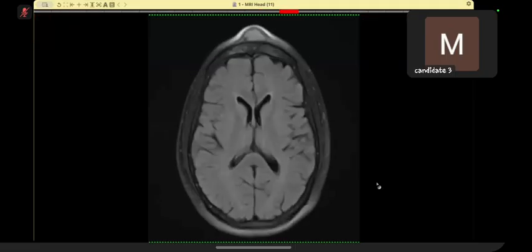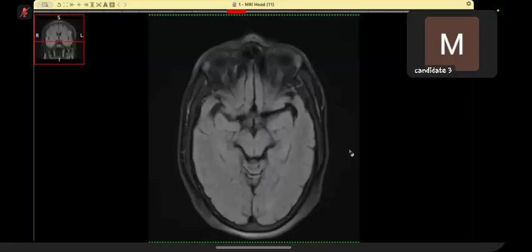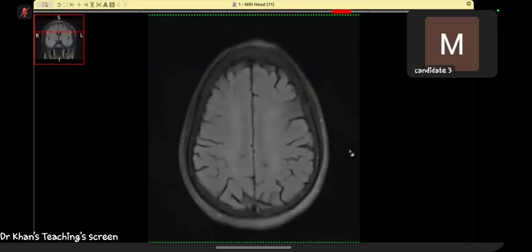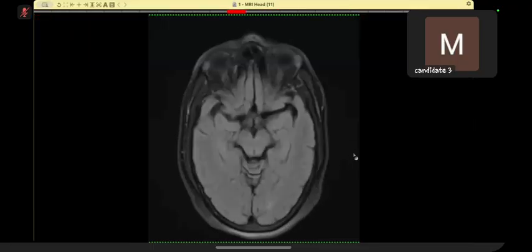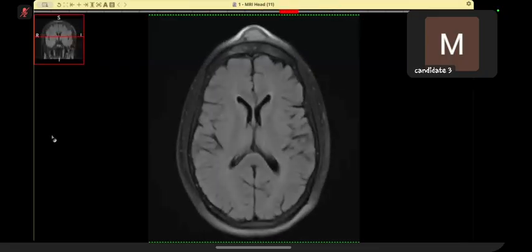I can also see a midline FLAIR hyperintense, well defined lesion in the scalp, anterior to the frontal bone in midline with overlying bulge. The underlying frontal bone is showing hyperintense edema signals, and the left frontal sinus is also fluid opacified. I cannot see any definite bone defect in this image. In my routine practice, I will also review any available CT brain or bone window to look for changes in the underlying bone or any defects.